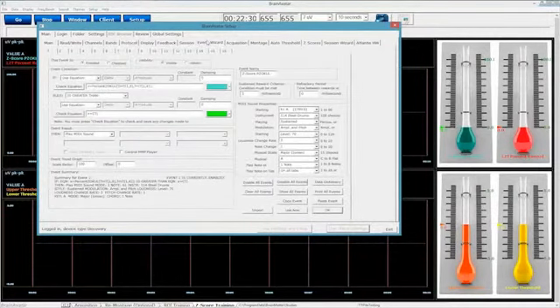So the Event Wizard, once again, has given the capabilities of that exact same feature right there, but as opposed to being a global for all of them, you can actually control it event by event. So where this one might be 0 milliseconds to 0 milliseconds, the next one might be a sustained reward criterion of 500 milliseconds and a refractory period of 0 milliseconds. It's controlled all by you.